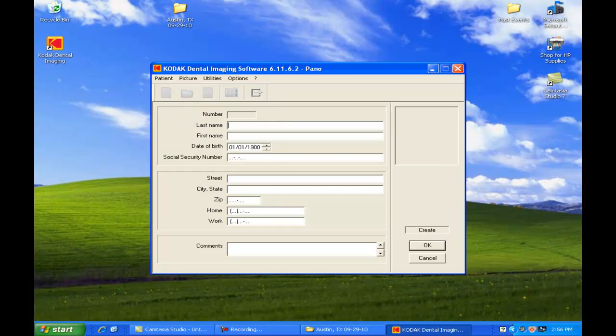Now for our purposes, and this is also for the purpose of having the social and name printed out on the image when you go to print this out, we ask that you put their social in the last name block. And you will put the social with dashes. And remember, the reason you're putting that in there is so the social and name prints out on the image that you print out to give to the soldier.